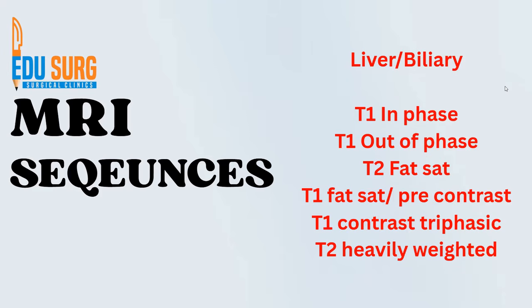Those are heavily T2 weighted images. So you'll understand what all these terms mean and how you can identify them, trying to just simplify the concept so that you can identify the images and then learn how the various pathologies will look in these images, if you understand the basics of water and fat and the ionic hydrogen in there.